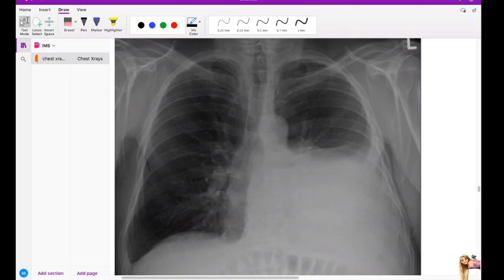So now pleural effusion, you basically you'll see loss of costophrenic angle. Okay, instead there will be a meniscus sign. Like over here, you can see it's like the fluid that accumulates in the pleura goes up like that because of some physics stuff. Okay, so you see a meniscus sign.